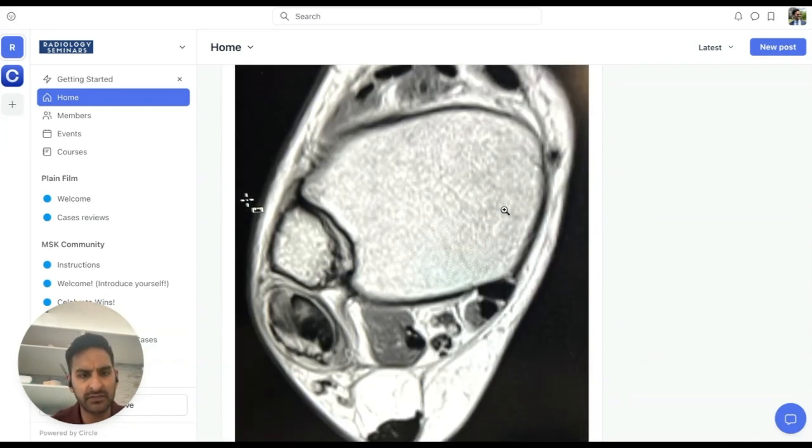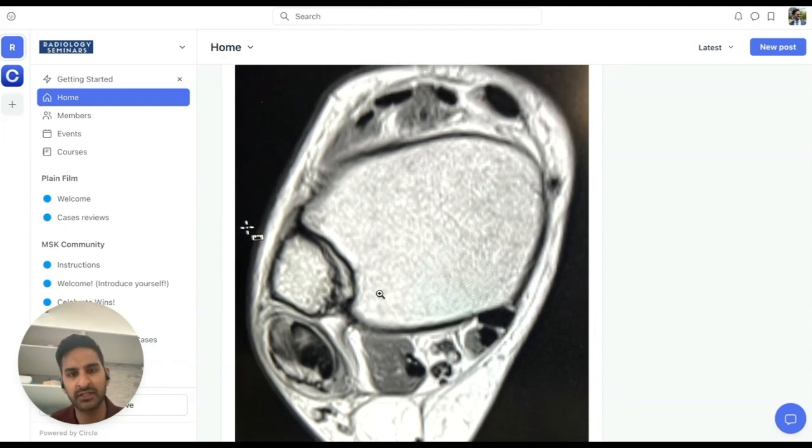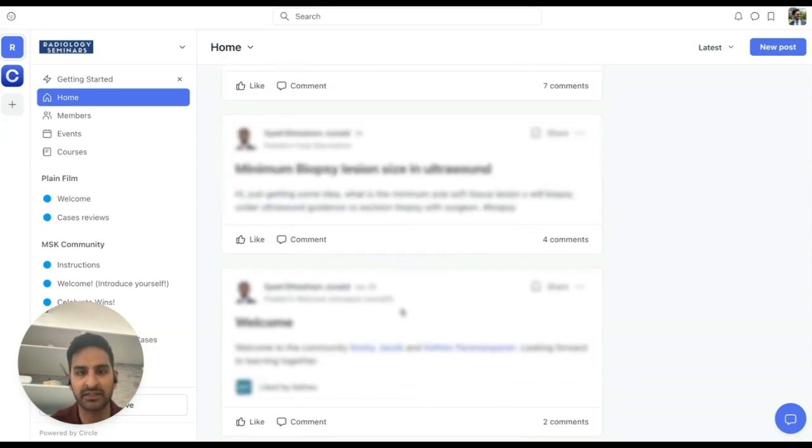Next case, it looks like we've got the image of an ankle within this region over here. You can see there is an abnormality. So where are we? We're in the lateral aspect of the ankle. This is the medial aspect of the ankle. You've got Tom, Dick, and Harry. And then over here is going to be the peroneus brevis and peroneus longus tendon. And here you can see that this is very edematous, and the brevis looks like it's about to split here as you get further down. This looks like a T1 weighted image, but you can tell this is very edematous and very abnormal. So that's the most likely abnormality there.